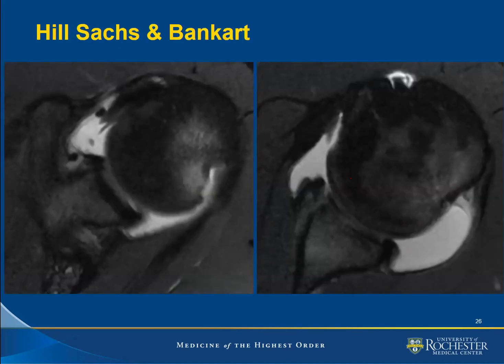So here's an MRI image from a shoulder arthrogram. I will point out how to look for the Hill-Sachs defect. We go to the level of the coracoid process, or slightly more superior than the coracoid process. And we're looking for this site of an impaction fracture involving the posterolateral aspect of the humeral head. And you can see nicely the bone marrow edema associated with this impaction fracture. As we move to the anterior inferior aspects of the joint, we could see that the glenoid has taken on that trapezoidal morphology where we've lost that corner of the glenoid.